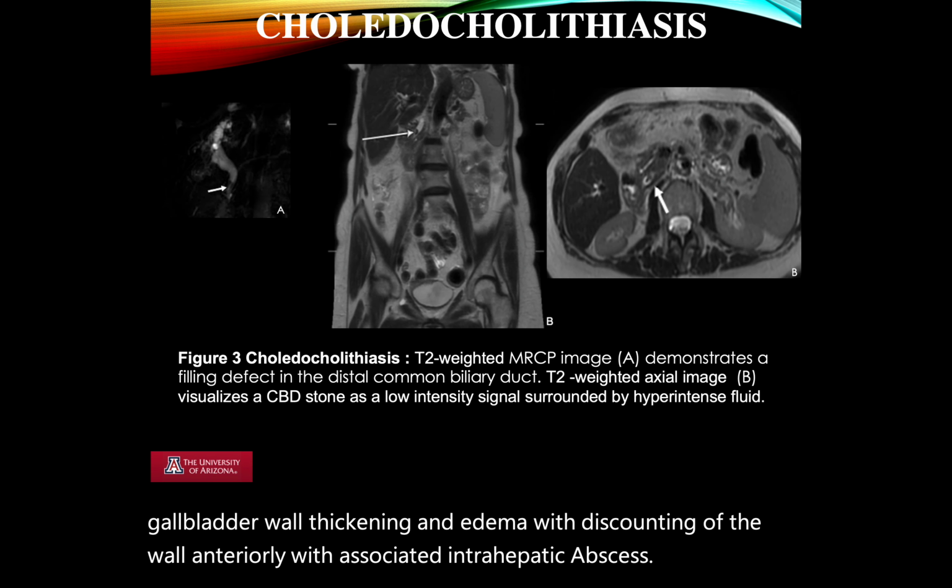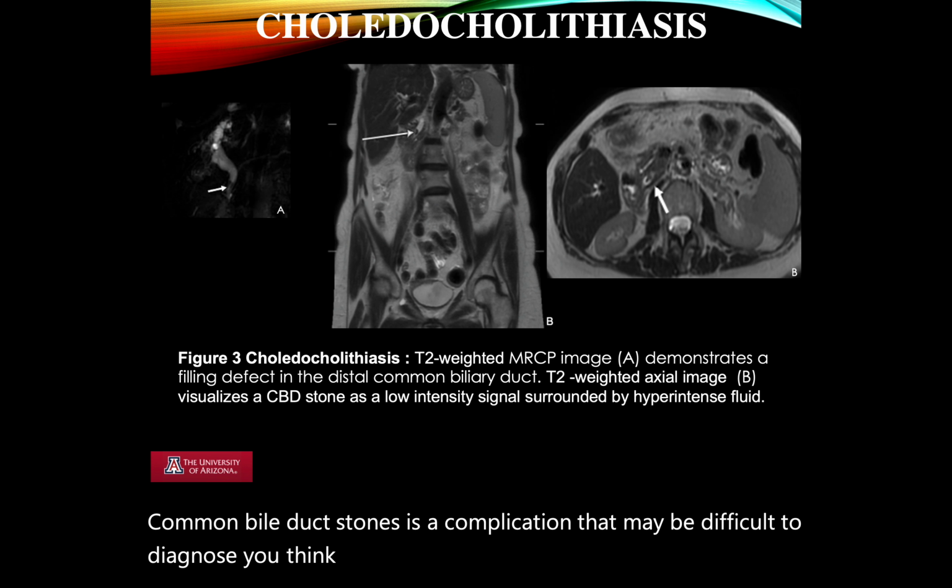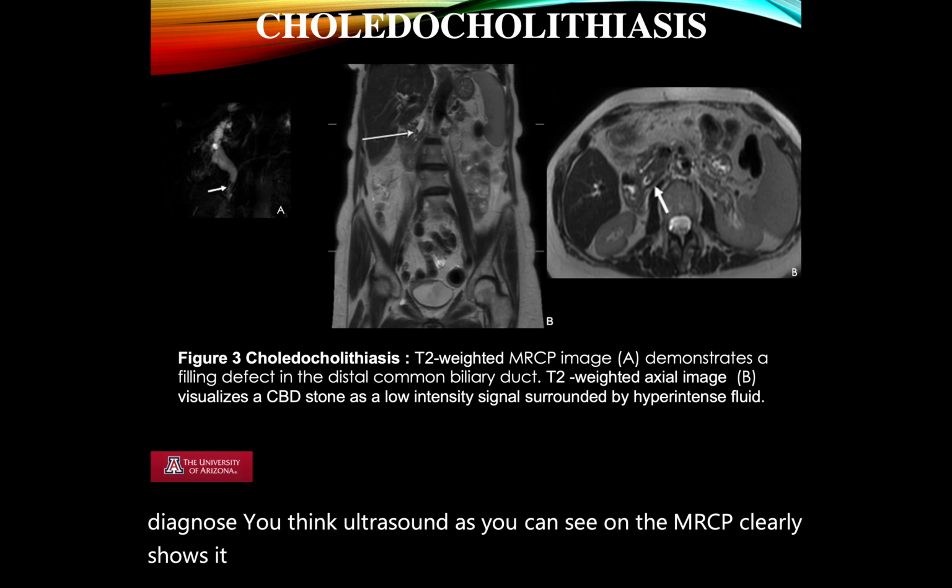Common bile duct stones is a complication that may be difficult to diagnose using ultrasound. As you can see on the MRCP, it clearly shows a distended common biliary duct with a filling defect in the distal segment representing a stone.